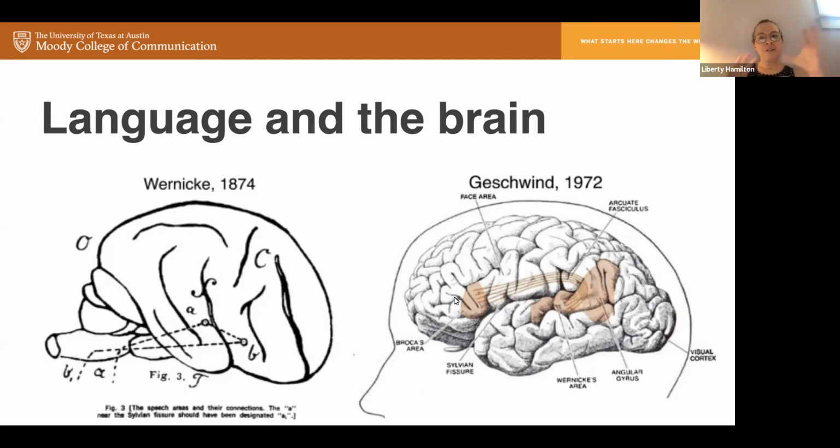I know this is not particularly a data talk, this is going to be more of a tutorial, but I do think that when you're analyzing intracranial EEG data, it helps a lot to have some a priori knowledge of where you might expect to see activity based on your electrode coverage. I'm showing these because we will look at an example natural data set, and you can look at the coverage of the electrodes across the brain and see if these are going to be in areas that you think might respond to your feature of interest at all.